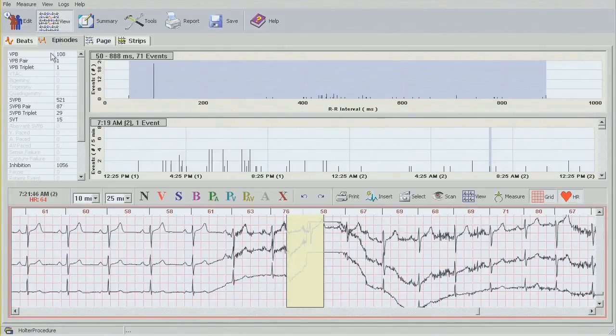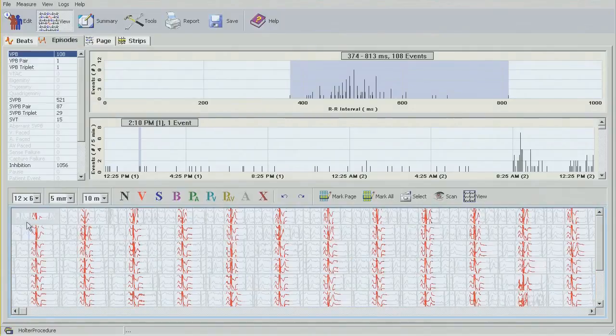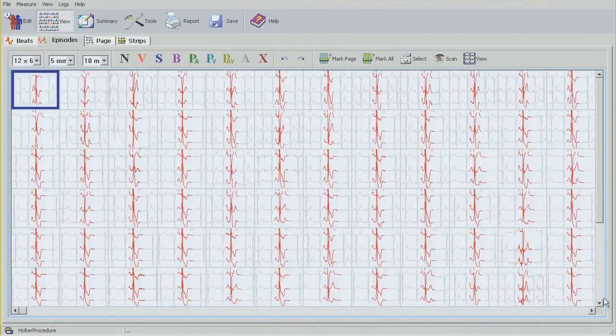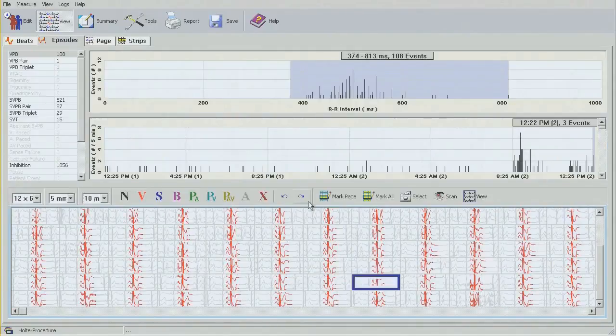So this brings up all the ventricular beats, couplets, triplets, supraventricular isolated beats, couplets, triplets, runs of SVT, and so on and so forth. So again, starting from the top with ventricular beats. I have seen them all already while working through our bins, so just a quick glance whether I haven't missed anything. And they seem to be all correct.